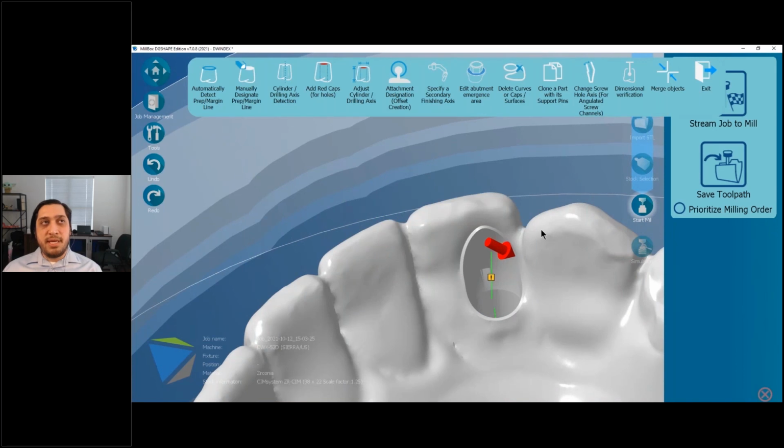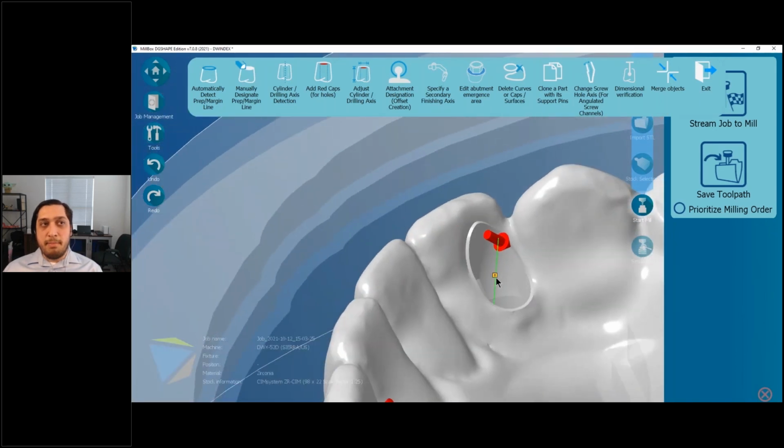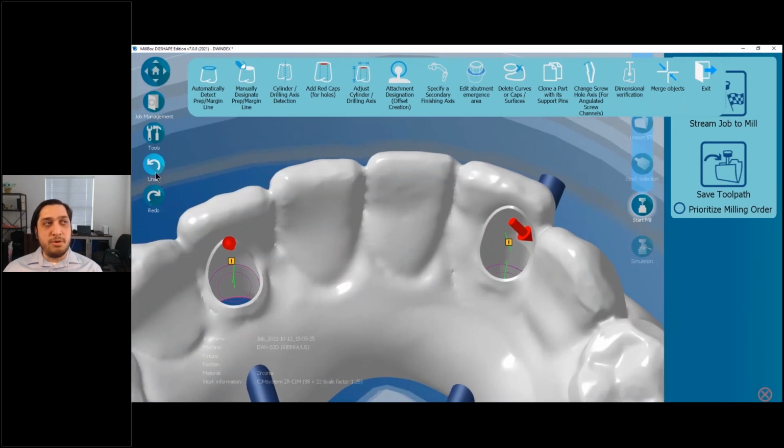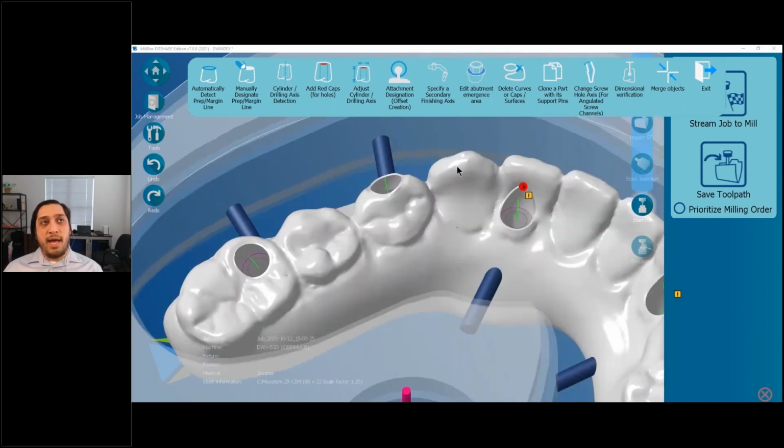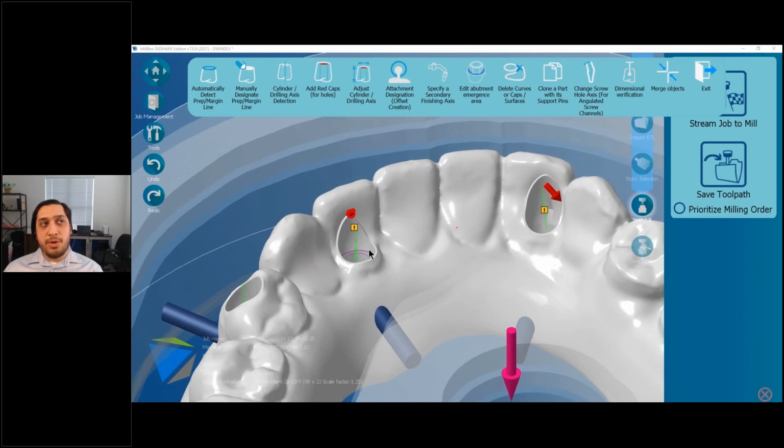But generally speaking, you can come in here and make those modifications, and the CAM software will accept those and move forward and fix them. So particularly over here, for example, we can go in and fix that, and it will fix that mesh. So sorry, my examples weren't 100% foolproof, but you can see that this is one, a new tool, and two, something that you just don't see in other CAM software. So as time goes on, these tools are only going to improve.